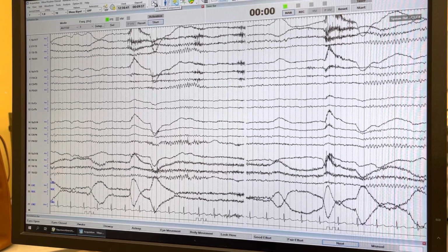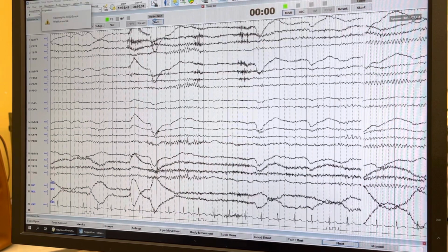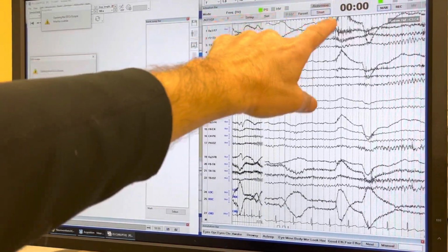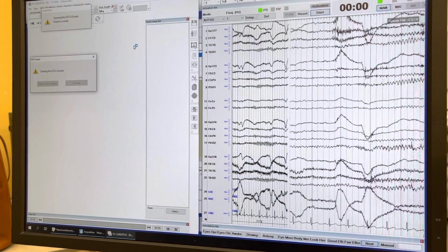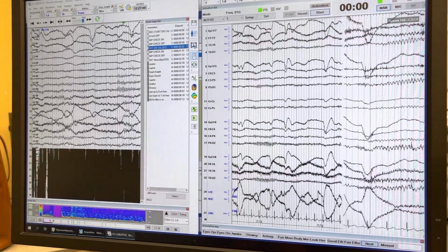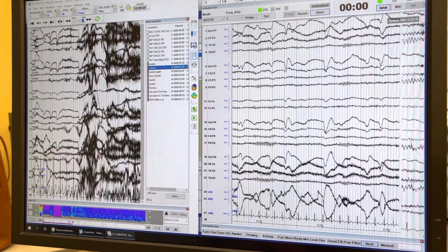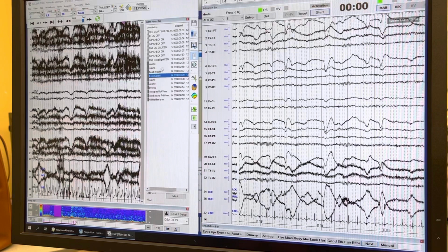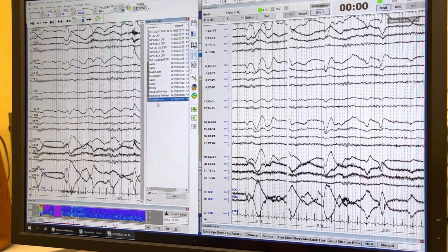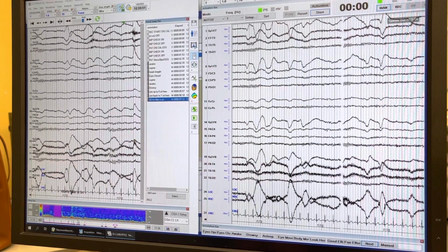This one here is your review. If you click on that, that's your review right here, and it's going to open up from what we already recorded. You can see it's recorded the EEG, and all your annotations are right here, so you can go right to your annotations if you want. So that's the review right there.